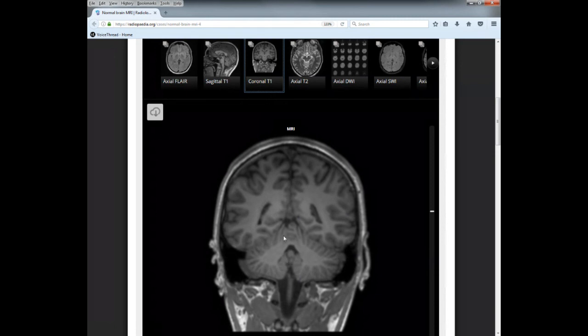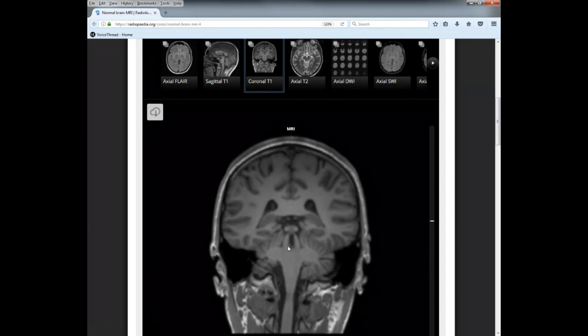Cerebellar tonsils, okay? The peduncles are right here, the superior peduncles, right here. Remember, this is where you have that relay system of your information from the cerebellum up into the frontal lobe, okay? Because remember, the cerebellum does not initiate motor functions, but it is crucial and important to coordinate along with the frontal lobe, literally to allow for coordination, swinging of your arms, that kind of stuff, together.